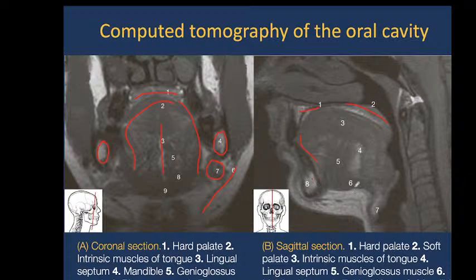This is mylohyoid muscles, and also sometimes we see the genioglossus muscles, but here is another projection, and we see only mandibula on this side. We also can distinguish the pharynx here. This is the upper part called nasal pharynx, nasopharynx.